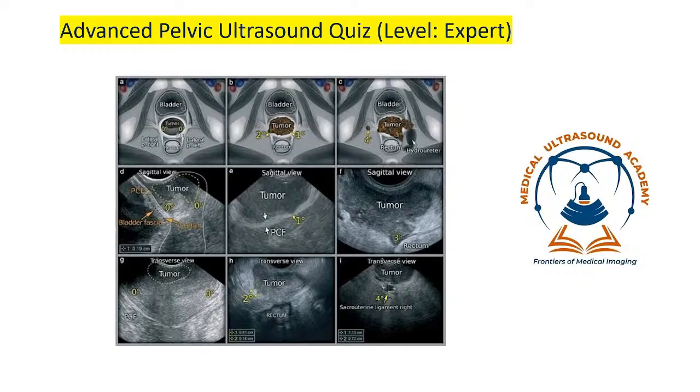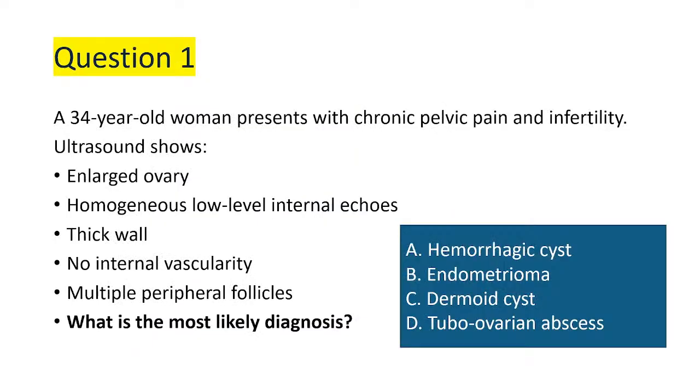The sonographic appearance is the blueprint that we use to come up with a diagnosis. So let's talk about the advanced pelvic ultrasound quiz. This one is for experts, those people who have been in the game for quite some time. They are the ones who are going to perform better in this quiz session. So let's go to question number 1.